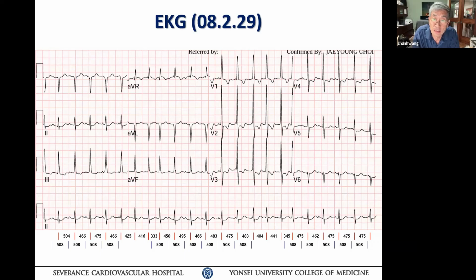But other than that, the patient does have right ventricular pathology, yes, certainly. I don't think the patient has situs inversus. And the patient probably had a ventricular tachycardia with underlying sinus tachycardia, completely dissociated. That's how I would read this ECG. Okay.